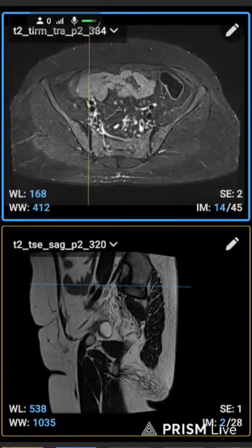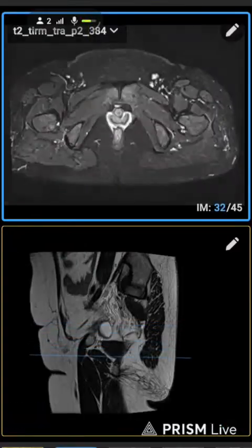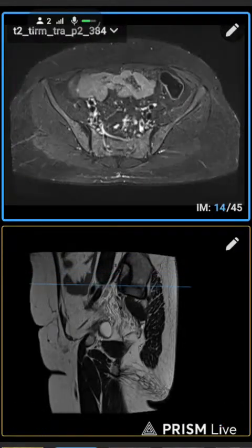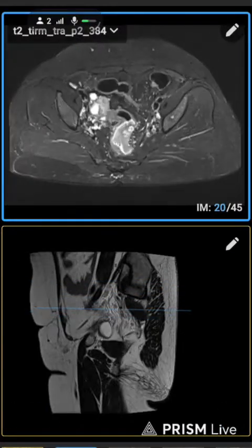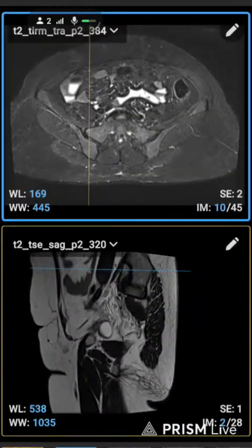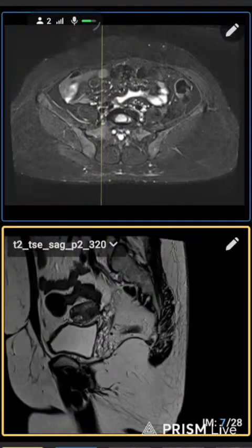In the pelvic area, whether it is prostate or female pelvis, fistula, also perineal abscess, we will need a view of the full pelvis if there is any type of lymph node, bony mass, or some type of infection anywhere. This sequence is T2 FS. We added it after the sagittal sequence.